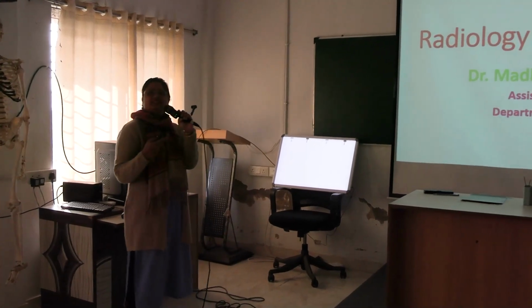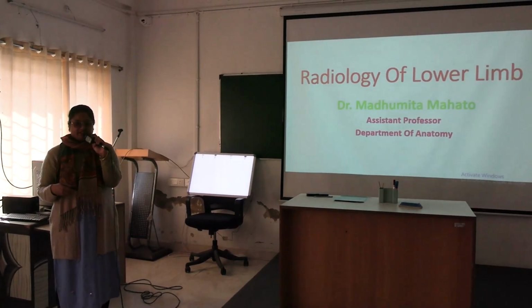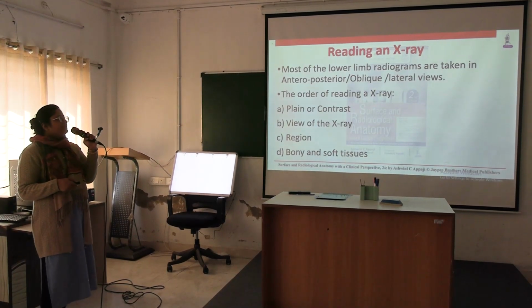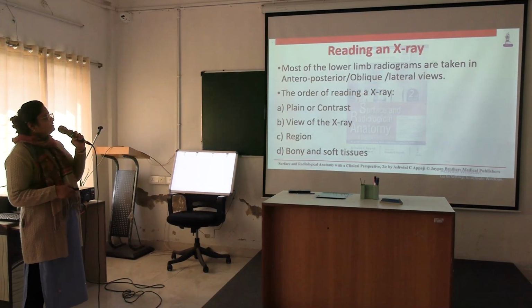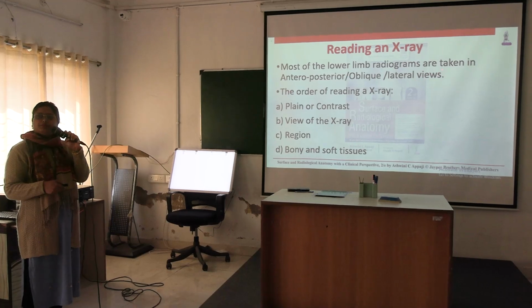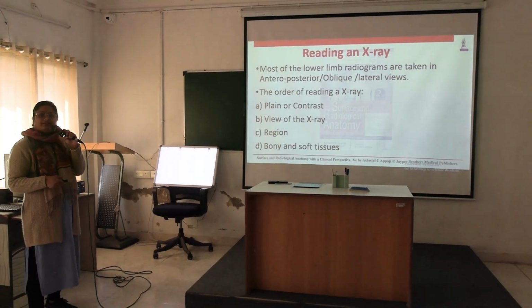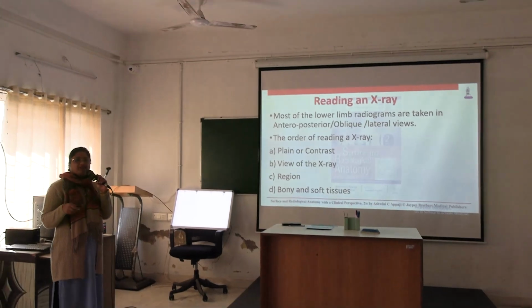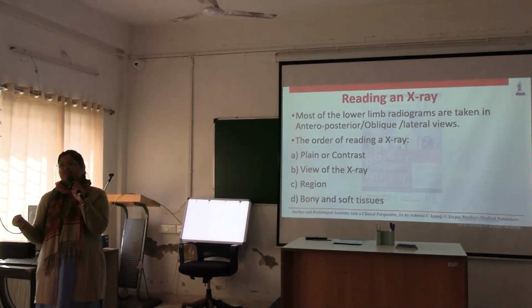So today we will see the X-rays of the lower limb. Okay, radiology portion. Most of the lower limb radiographs are taken in these views: anterior-posterior view, oblique view, and lateral view.